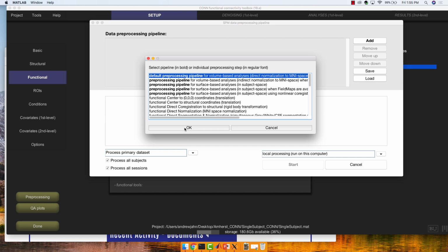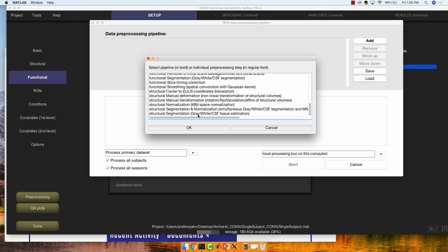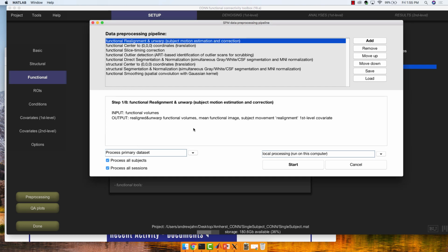Okay. So these are all good questions, and they can be modified. The developers have said, these give us the best results. Here's what we know works. You have control later over things like, for example, the bandpass that's applied. But they're particular about what options you have direct control over here.